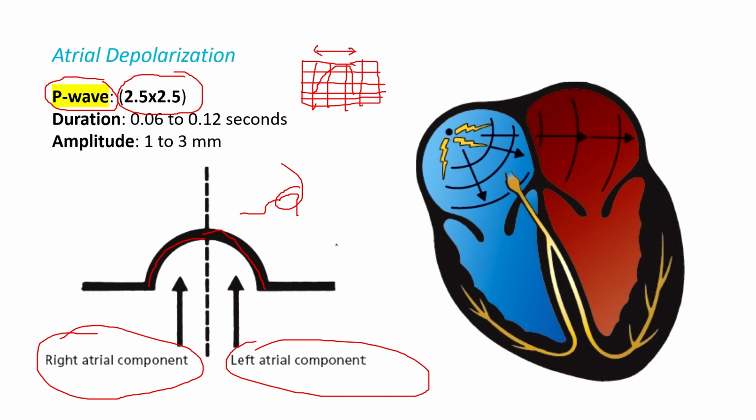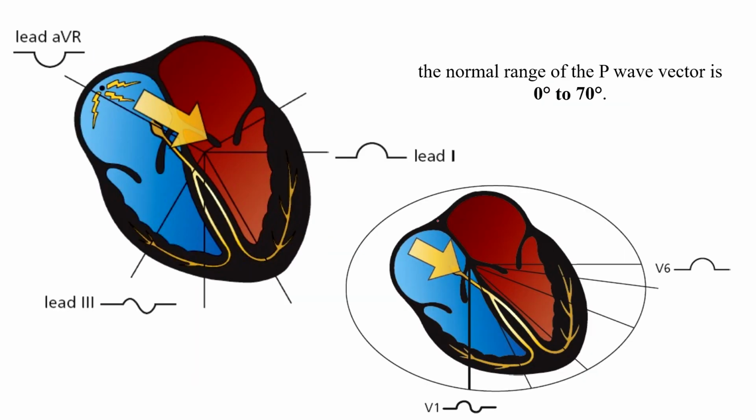But if there's a problem with the first part going higher than normal, we can see that's the problem with the right atrium. That's how you can make sense out of an ECG if you know the concepts. So I hope that's clear, and now let's move forward.